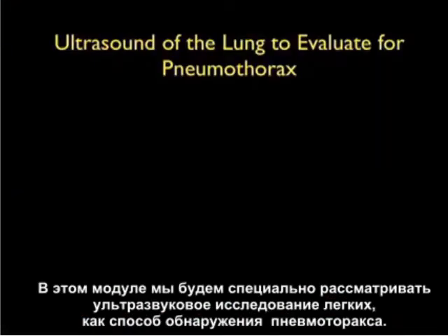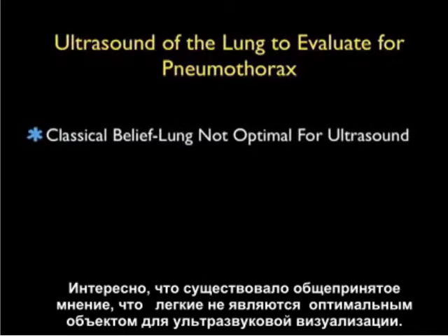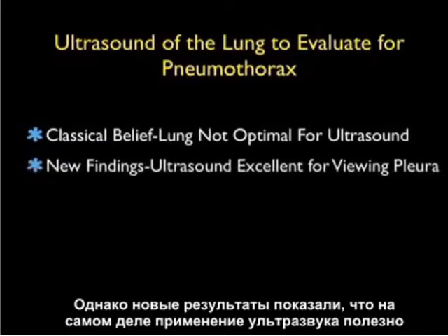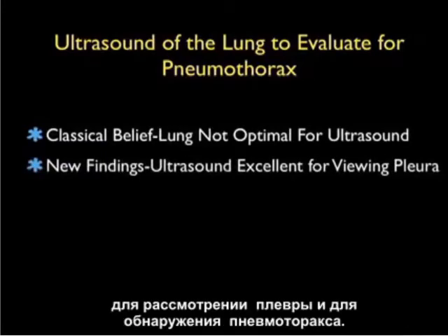In this module, we're going to look specifically at ultrasound of the lung to evaluate for pneumothorax. Interestingly enough, a classical belief was that the lung was not optimal for ultrasound imaging. However, newer findings have shown that ultrasound is actually an excellent modality for viewing the pleura and for detecting pneumothoraces.